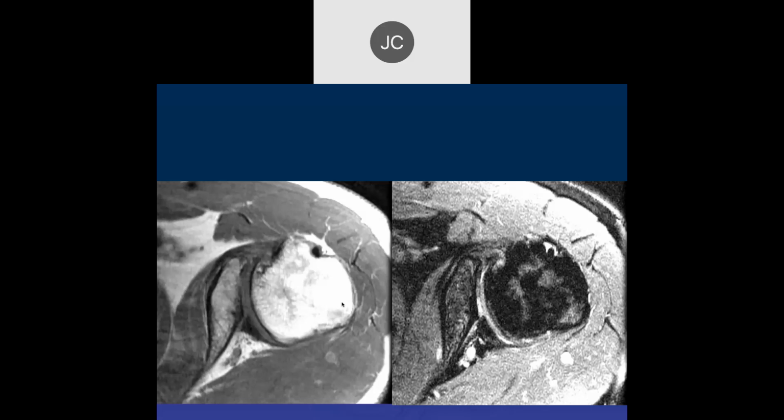Let's see. It looks like the glenoid here is retroverted quite a bit, and then posteriorly, is that the labrum that looks thickened and torn? Yeah, so you basically see that the posterior half of the glenoid just isn't there. That's what this is. Very small glenoid, severe retroversion, and then this is the compensatory large posterior labrum that you get in these congenital variants of the glenoid. Fortunately, these congenital variants are not as common, because these lead to marked instability of the shoulder. John?